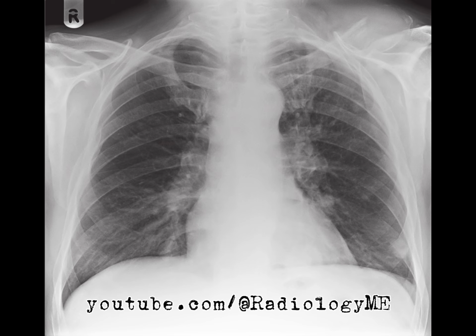At this point, I would definitely recommend staging CT scans to get a better sense of the extent of disease, particularly to assess the mediastinum, abdomen, and pelvis for further metastatic spread, and to potentially locate the primary tumor if this is a first presentation.